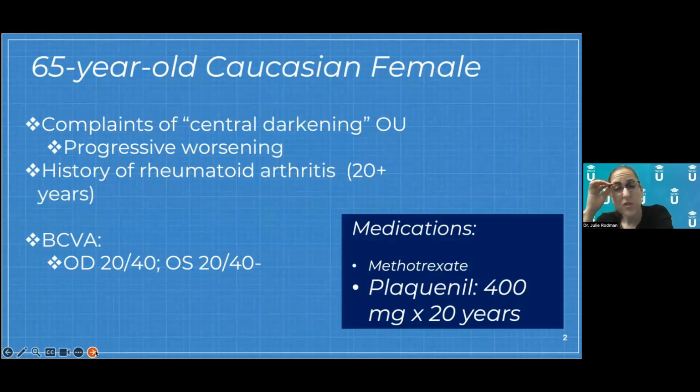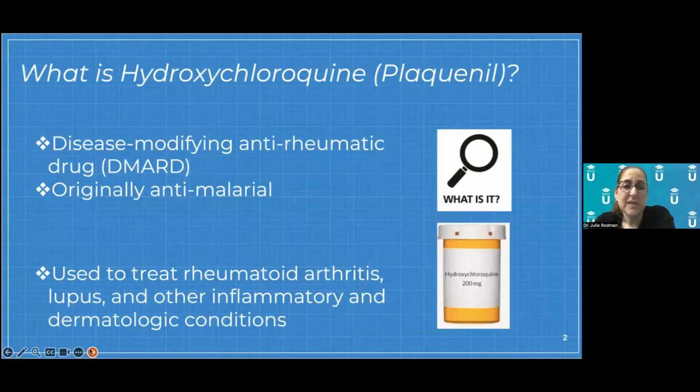So what I just wanted to do very briefly in the few minutes that we have left is talk about Plaquenil toxicity and what the proper workup is of these patients. I would say on OCT Connect, we get a lot of questions on, does anybody think this is Plaquenil toxicity? And I'll preface by saying that you need to have a really high definition, good quality scan, because if you're looking at a scan that's very pixelated, it's very difficult to see toxicity.